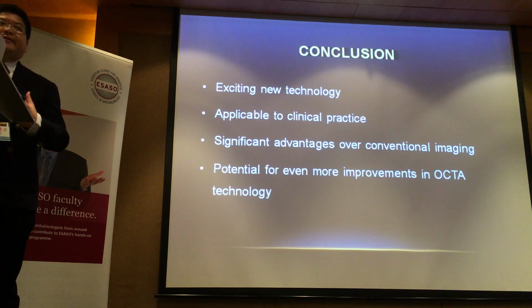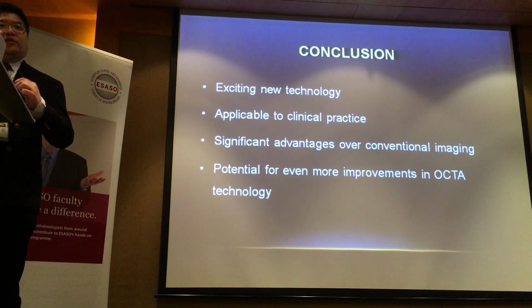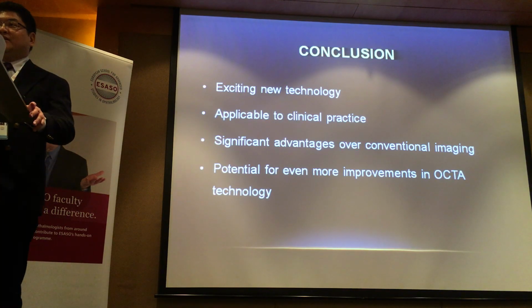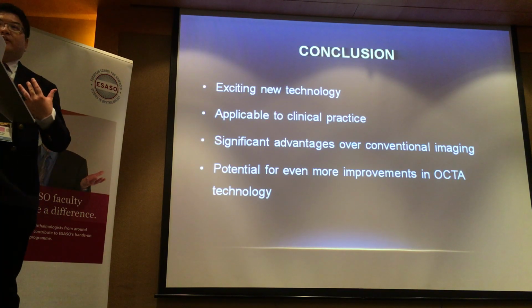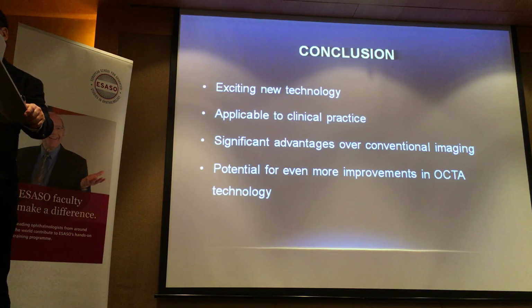Do not entirely assume it is exactly comparable to a fluorescein angiogram or an indocyanine green angiogram. There are differences, and it's up to us to really try and learn what those differences are, and not make mistakes. I'll perhaps just end with this point.